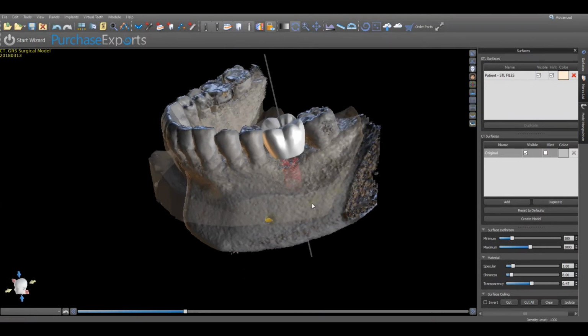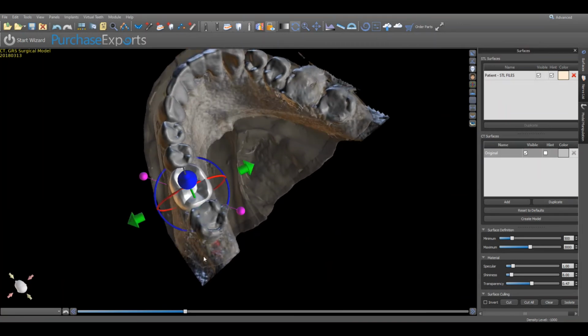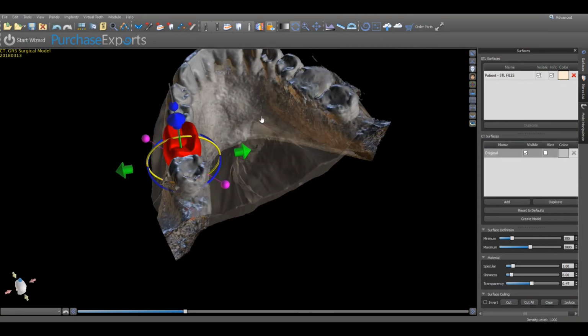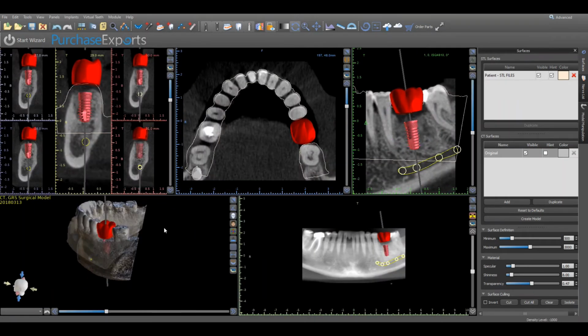The tooth will be either automatically rendered in conjunction with the orientation of an existing implant, or a tooth pointer will appear requiring the individual placement of each tooth per implant. Both teeth and implants can be adjusted 360 degrees in infinite positions in the X, Y, and Z planes.